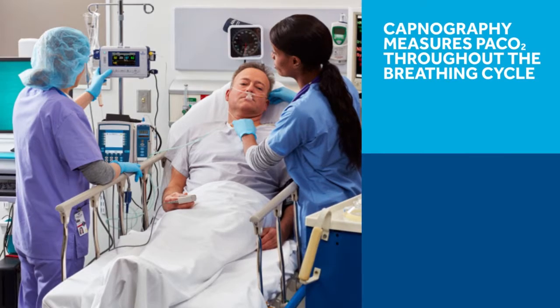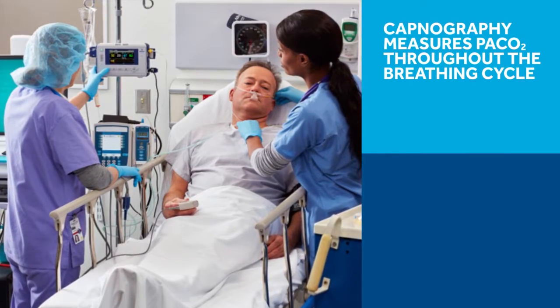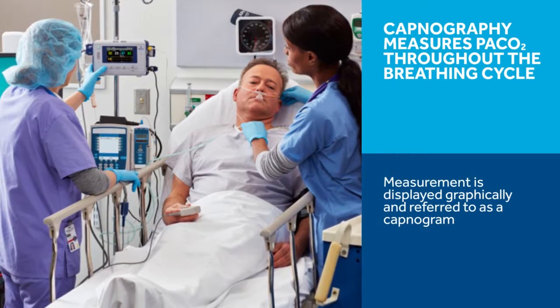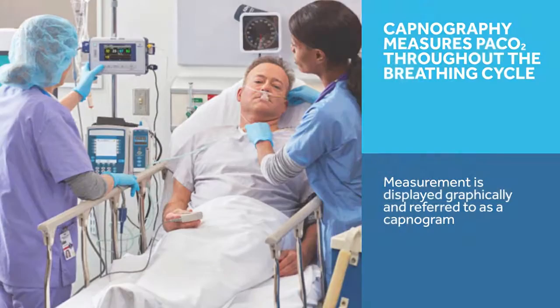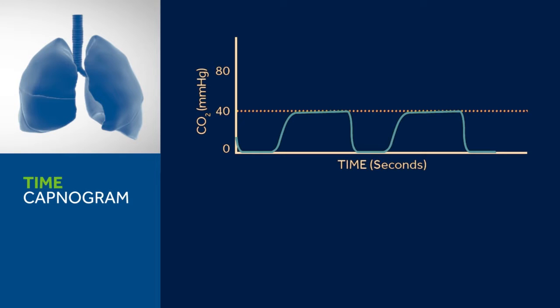Capnography is a non-invasive, continuous measurement of the concentration of exhaled carbon dioxide, CO2, during respiration. When the CO2 concentration data is displayed as a graphic waveform, it is called a capnogram. There are two main types of capnograms, time and volume.